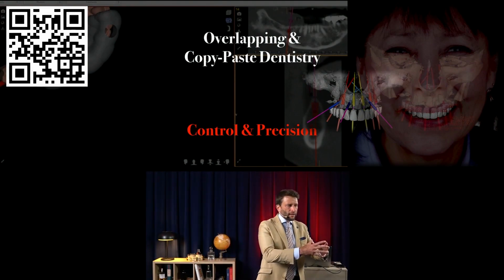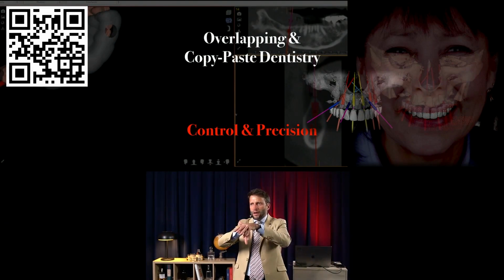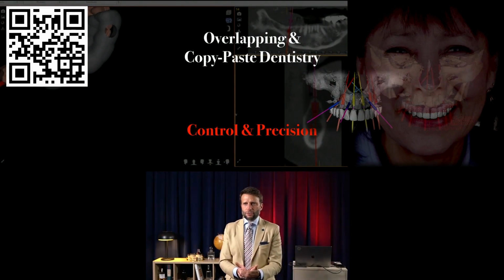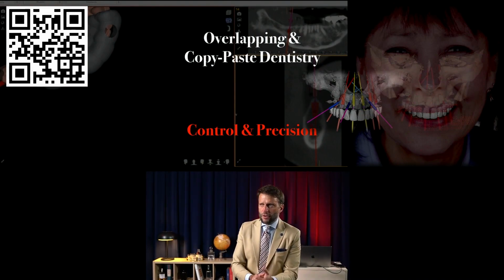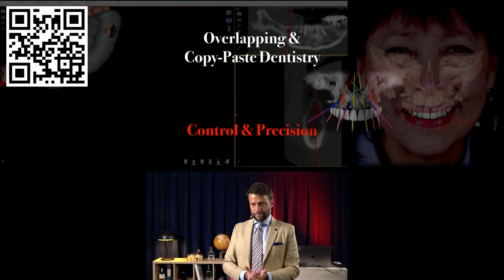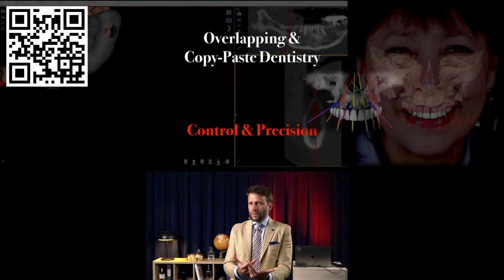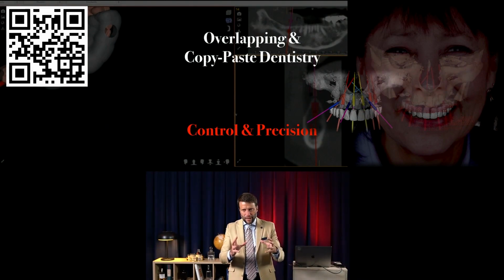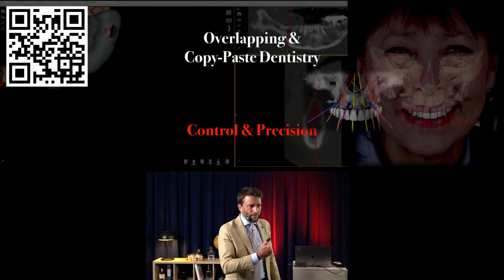If you have a case today, and after 5 years you scan this patient again and you want to compare, you need to have enough information in the mouth to overlap these files. That's why it's so important to have a very, very good palate scanning. The palatal area is one of the main areas that will not change down the road. It's like the fingerprint of the mouth. So if you have a nice scan of the palate and a nice scan of the vestibule on the pre-op, it is very important.